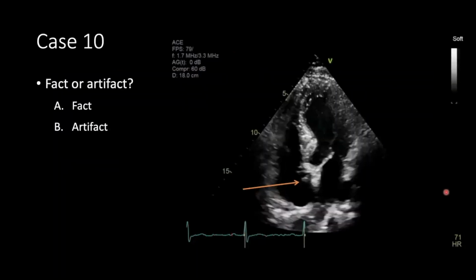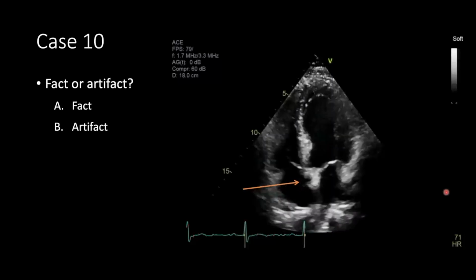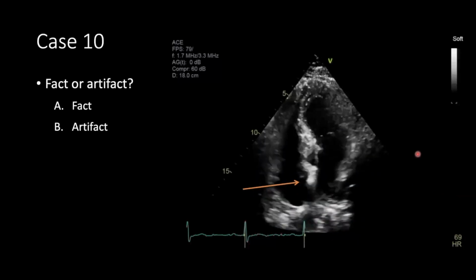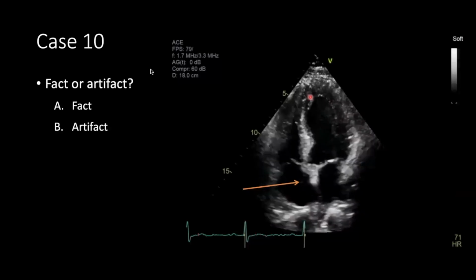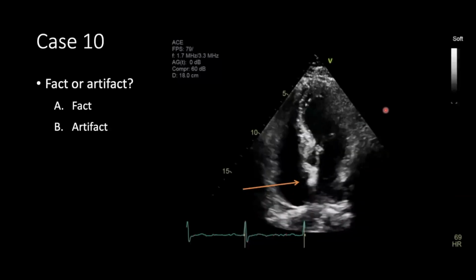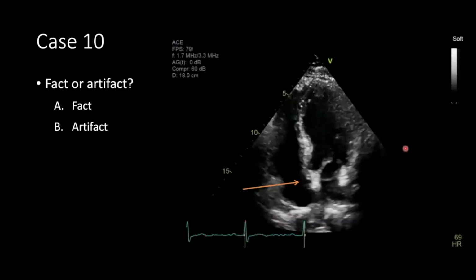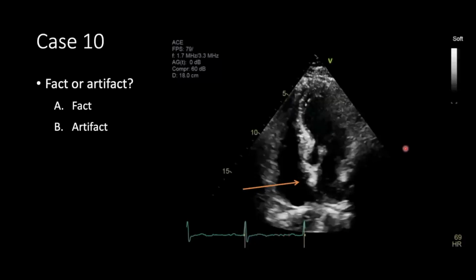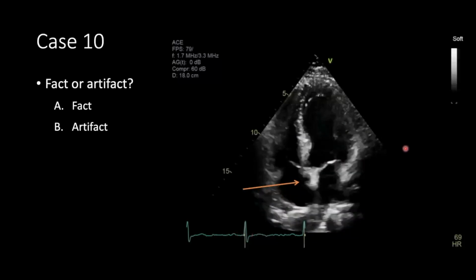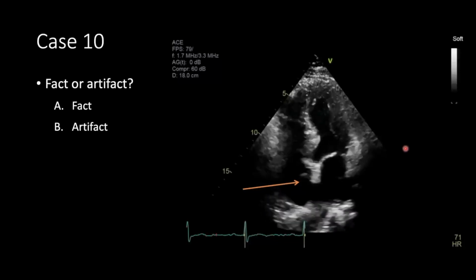Okay, let's try to get through the next couple of them pretty quickly, just because there are some interesting ones at the very end, and just in the interest of time. Okay, sorry. Do you guys think this thing here is real, or is it just an artifact? It's projecting it. Okay, yes. Real. Two thirds saying real, one third saying maybe artifact. Kind of the same here. Some people think artifact, or does everyone think it's a real finding?